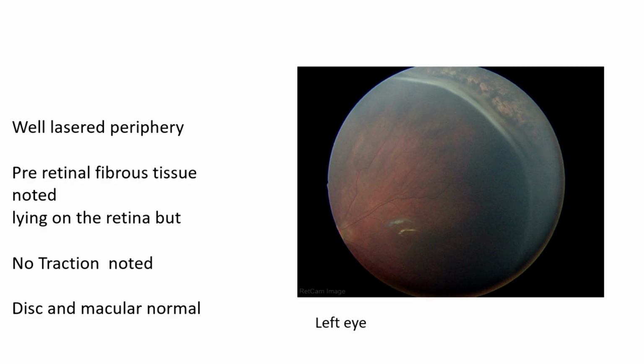It looks slightly elevated. This tissue is elevated, no doubt about it. Yeah, but there's another tissue, it looks like the inside retina is also slightly elevated. Slightly elevated. Okay. So this is a two-dimensional picture.